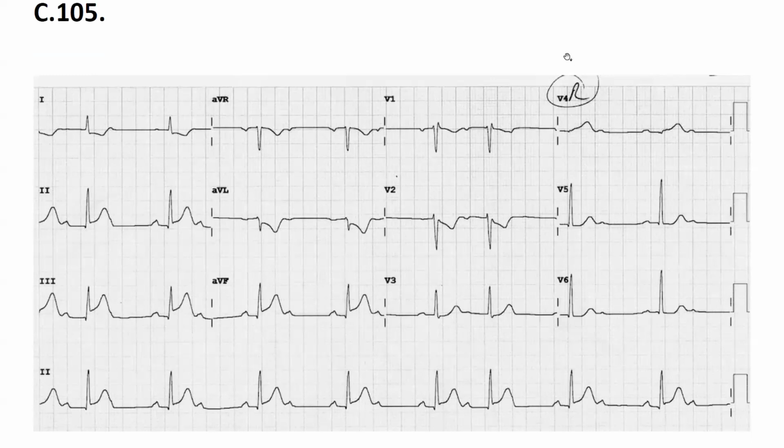Hello, Professor. Hi there. So first we have to check if it's rhythmic or not. It's not rhythmic. Good. Then we have to check for regular sinus rhythm. Lead two is positive, aVR is negative. Then you have to check about the P waves.